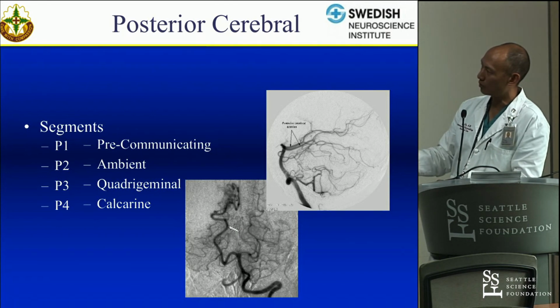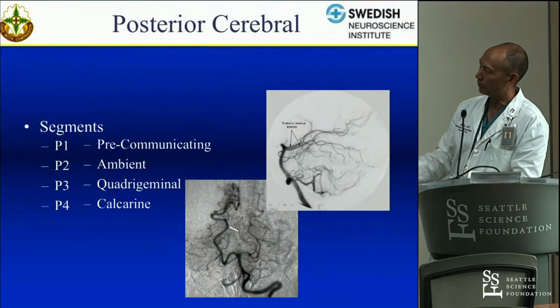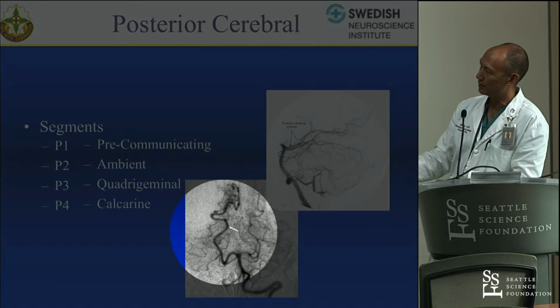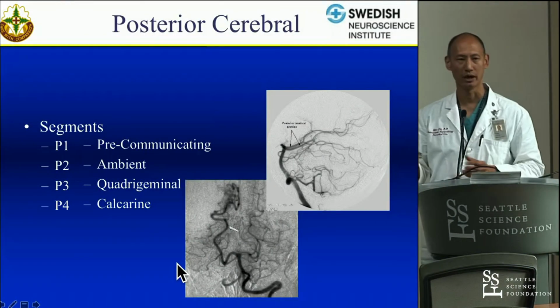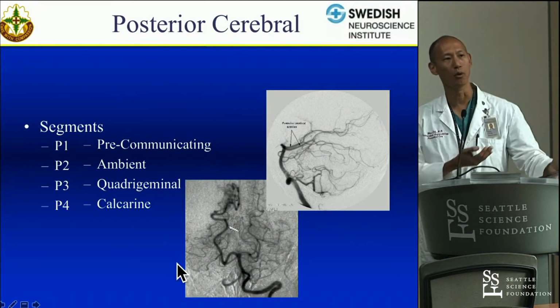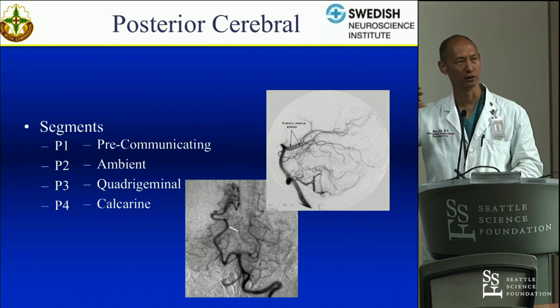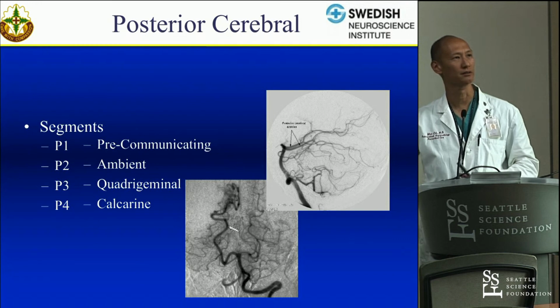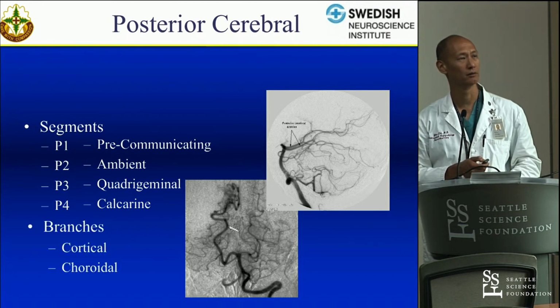Another important cortical branch to be aware of is that oftentimes there's a branch that arises from the P2, P3 segment that runs laterally and inferiorly, and that inferior temporal artery can supply both the inferior temporal pole as well as the inferior temporal gyrus. And that's a rich collateral zone with the infrasylvian branches of the MCA. I think that's about all I wanted to talk about.